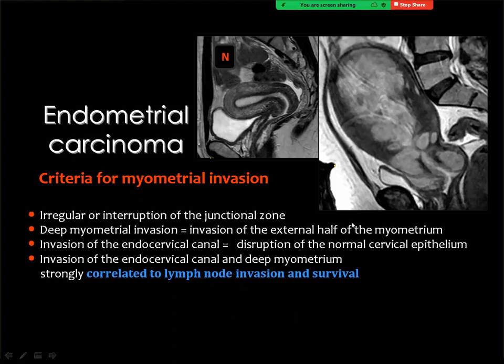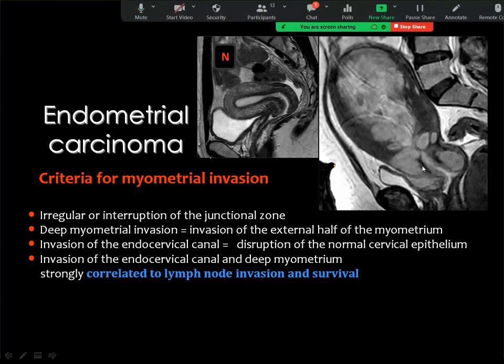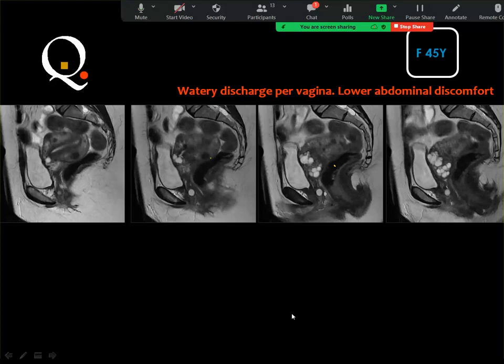And sometimes you got an endometrial mass which is invading the myometrium, and this is endometrial carcinoma. If the carcinoma has extended to the cervix, this is a stage 2 endometrial cancer. But the cervical cancer, if totally confined to the cervix, may extend into the uterine body, and at that time you will see that the main bulk of the tumor is localized to the cervix.